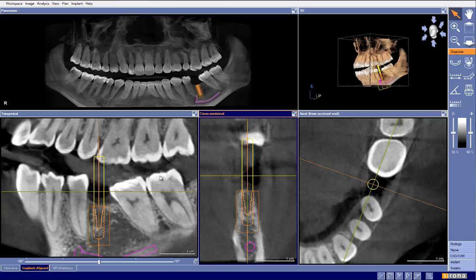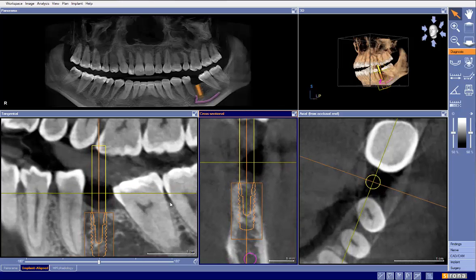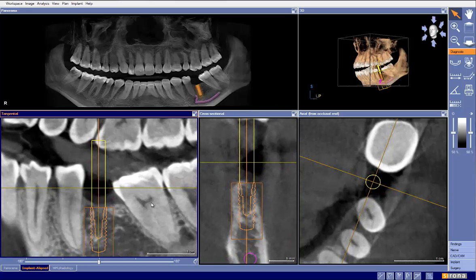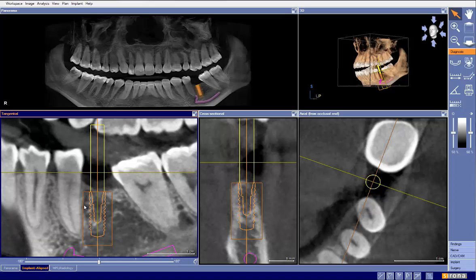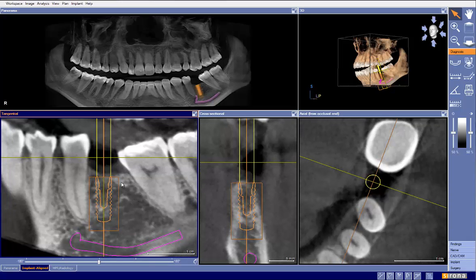Now I have a good level plane. I have a good occlusal table. I'm more ideally placed mesiodistally, far enough away from adjacent root number 21. This would also bring me into the use of this particular implant. One, we see that this root curves a little bit. We're getting a little closer here, not overly close, but a little closer.